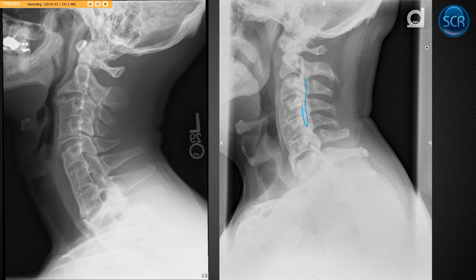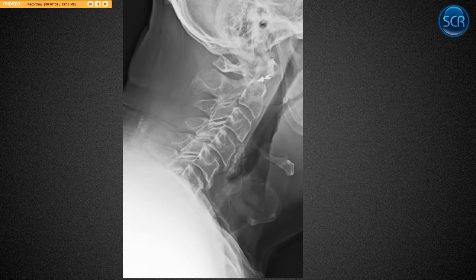Well, it looks fused because there's posterior longitudinal ligament calcification. All right, what did I want to show in this case? This one looks normal, just some routine degenerative stuff. So osteophytes can mimic DISH a little bit. They can be quite big in the cervical spine in some instances and curl around.